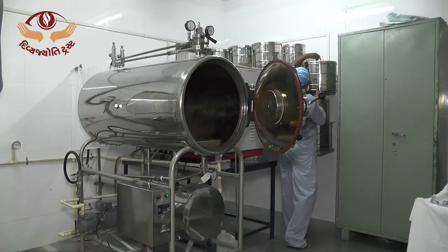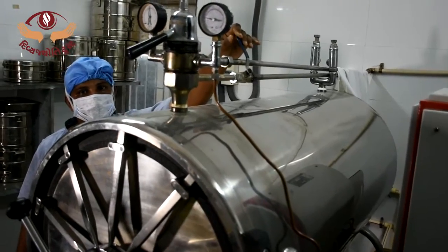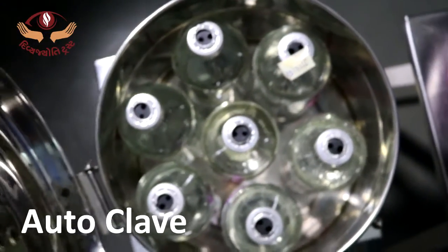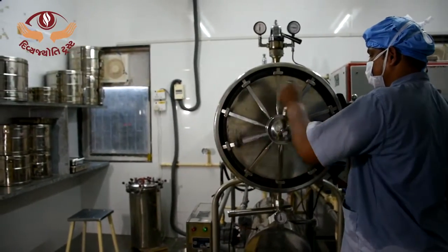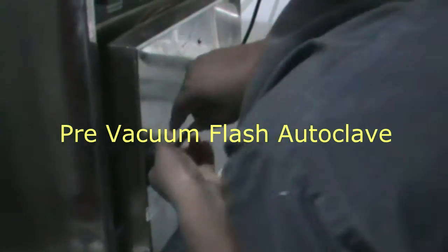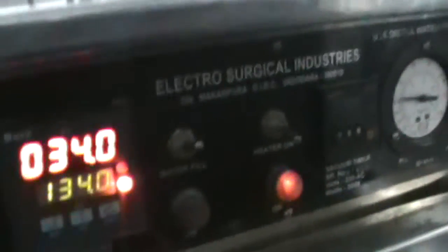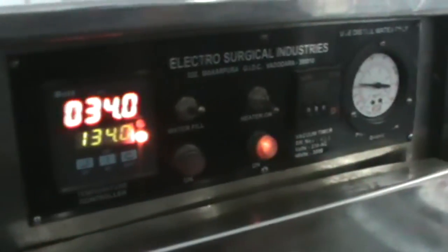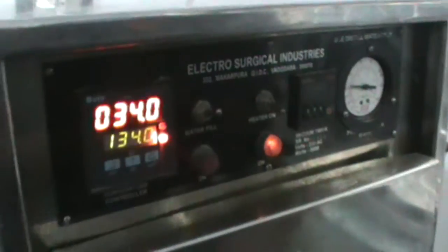Sterilization. Sterilization by heat or autoclaving is the most popular method because of its simplicity, reliability, and accuracy. It is cheap and environment friendly. Autoclave. Almost any article which is heat stable can be sterilized using the autoclave. Pre-vacuum flash autoclave, class B/class S, requires a holding time of 5 minutes at 134 degrees Celsius and 30 pounds pressure. Cannulated items and items with long tubings can be sterilized in this type of autoclave machine only.